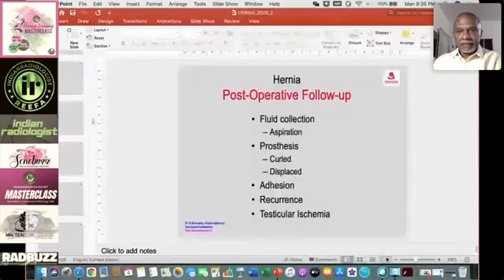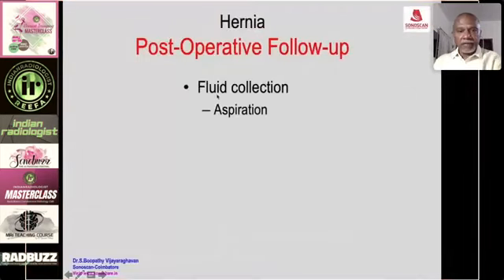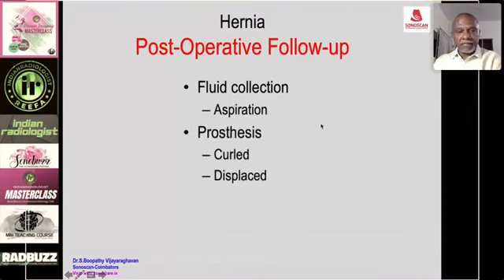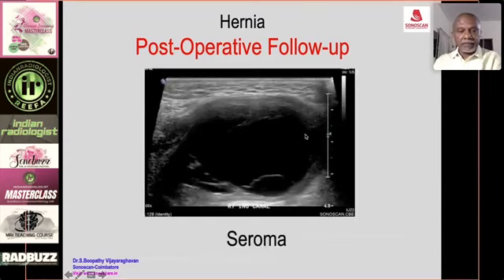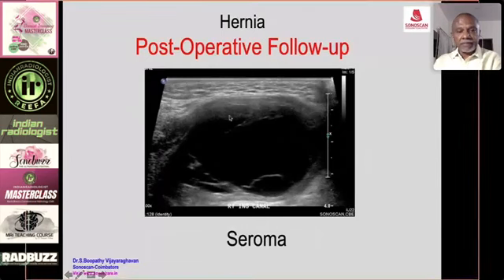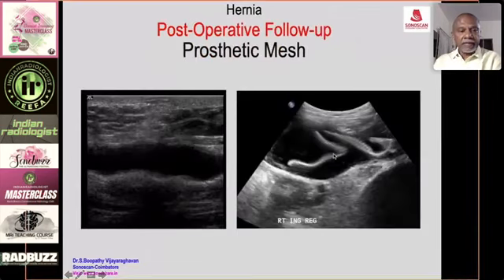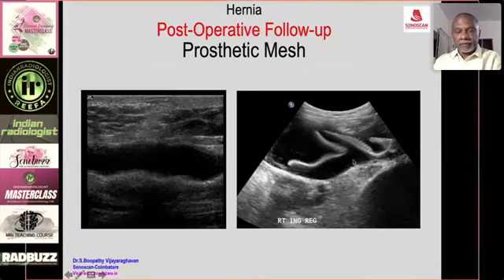Ultrasound is also useful in the postoperative follow-up to look for any fluid collection so that it can be aspirated, and to look for the prosthesis, adhesion and recurrence, and testicular ischemia. So here, immediately after surgery, you get a fluid collection, that is a seroma, which can be aspirated. A little later you see fluid collection secondary to inflammation, mesh inflammation.